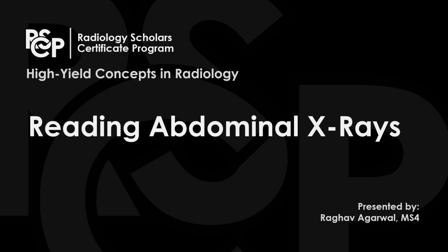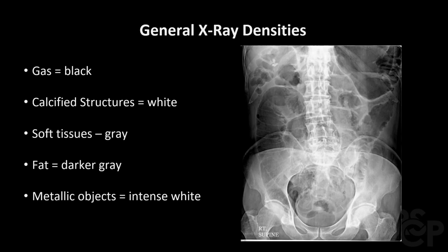I'm going to give a lecture today to give you the basics of how to read an abdominal X-ray. This here is a general abdomen X-ray.